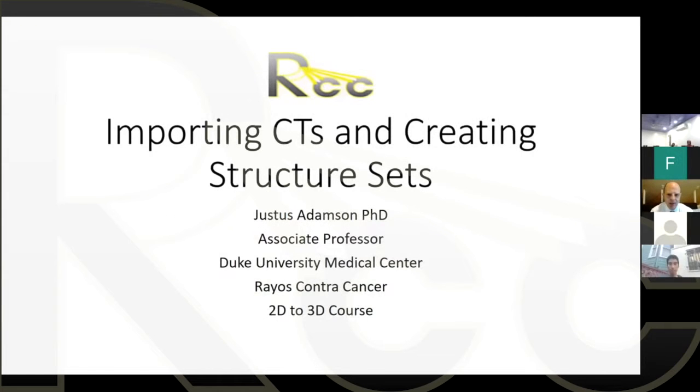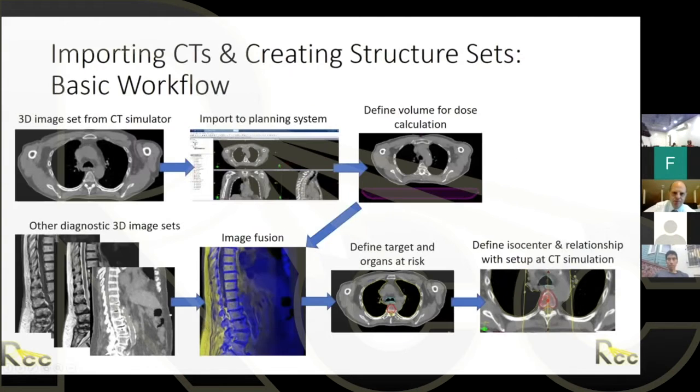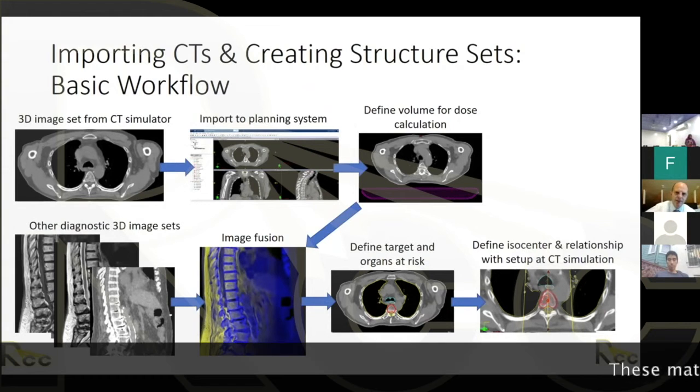3D treatment planning procedure. And so this is the portion that is importing CTs and creating structure sets. This gives a nice little overview of the entire process, moving from the top left to the bottom right. This is the process of importing CTs and creating structure sets, the basic workflow.